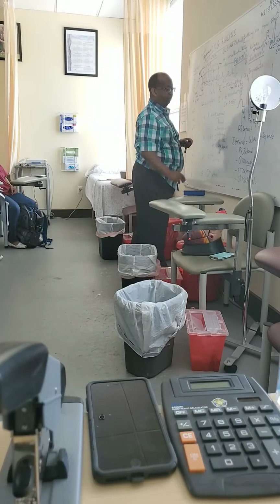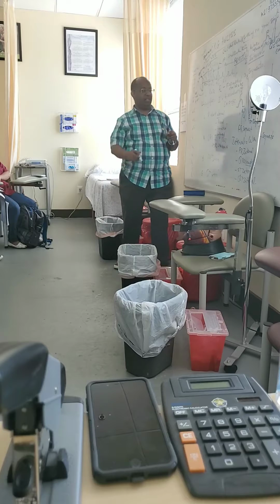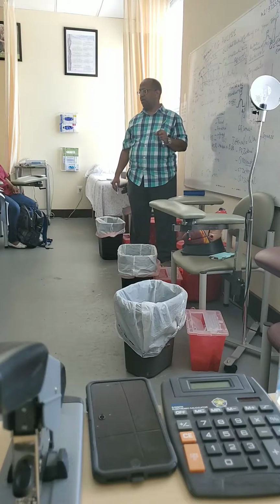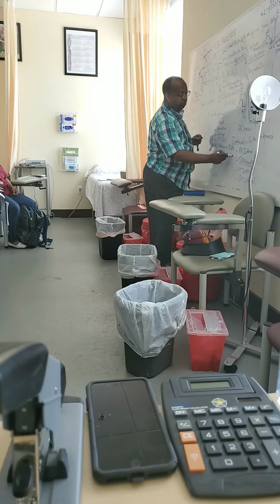And what do you do? From the Q to the R. Because each little box is how many seconds? 0.04 second. Right. So you multiply those little boxes by 0.04. Let's say you count 2, multiplied by 0.04, and you'll get 0.08.